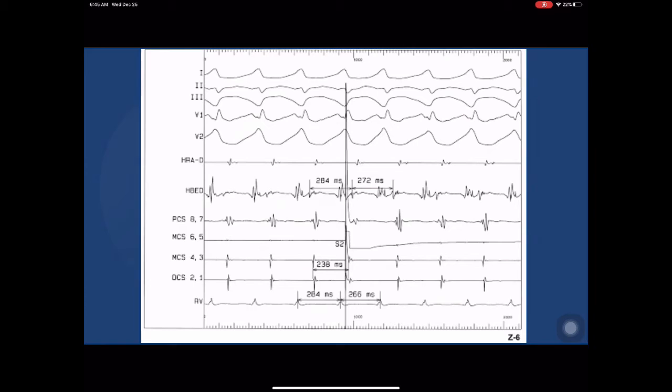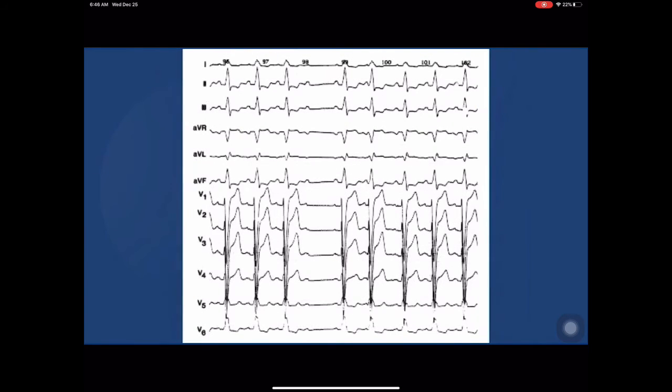You didn't do this. If I put a late PVC, you know that will never, ever pre-excite the atrium during AV node reentry. So this PAC, in essence, becomes a late PVC. And a late PVC cannot cause AV node reentry to be captured. So you have one PAC that confirms your diagnosis. Please remember this maneuver. You'll find it very useful, I believe, in your careers as electrophysiologists. So let's go on to this tracing.